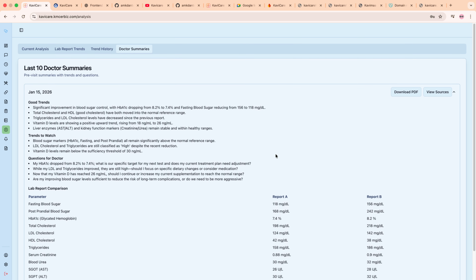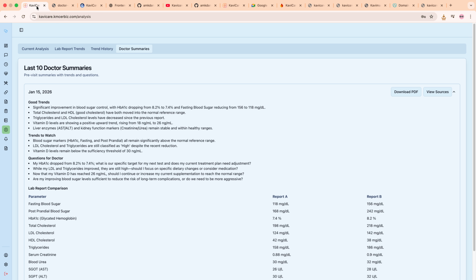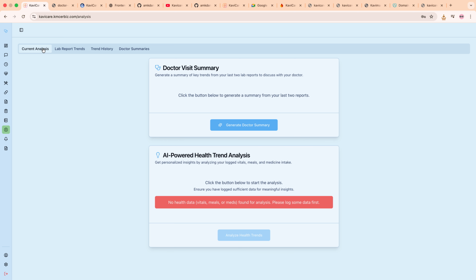You can download it as a PDF, and you can then see this in the PDF also, which you can take a printout of and put in your folder. Here also you can show the view. So that is one way to see the report.